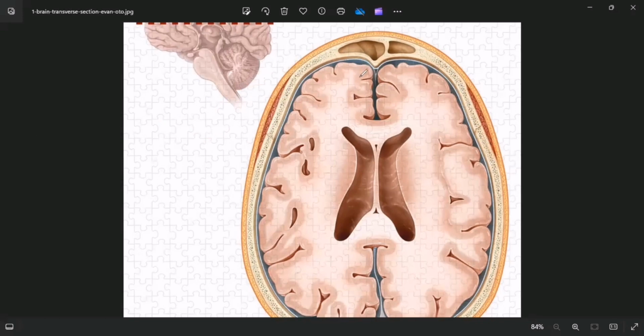You see that the brain, when you look at the cross section, has been demarcated into what color is this? I'm not sure I know the name of this color. What is the name of the color? Pinkish, reddish. Kind of reddish brown or something.